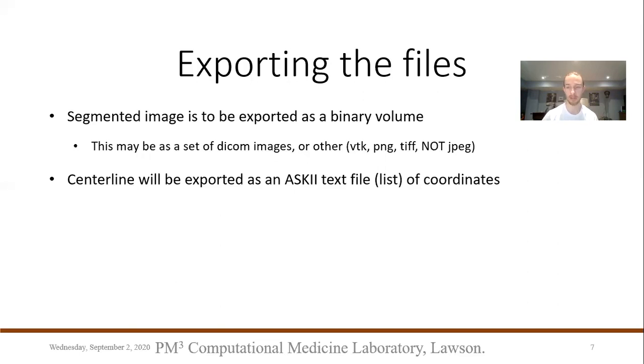I would stay away from JPEG because these are compressed image formats, and so you can lose some of your resolution. And the centerline, in my process, will be exported as just a plain ASCII text file with a list of the coordinates within the centerline.